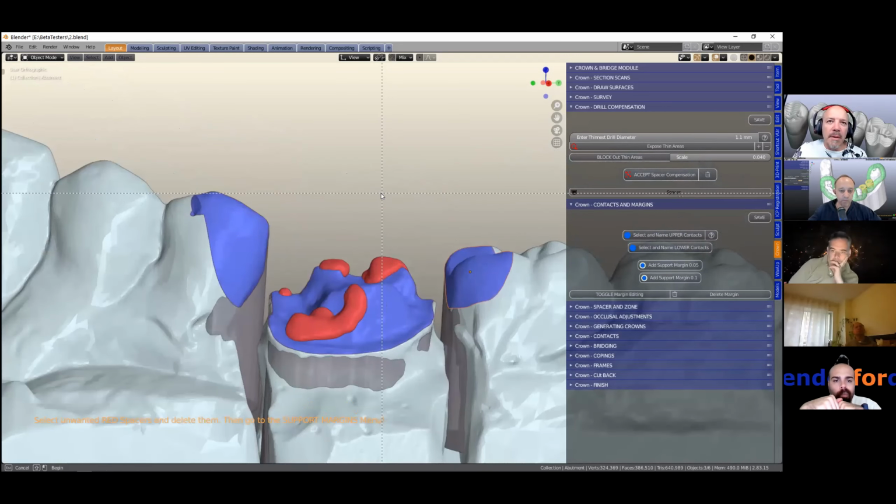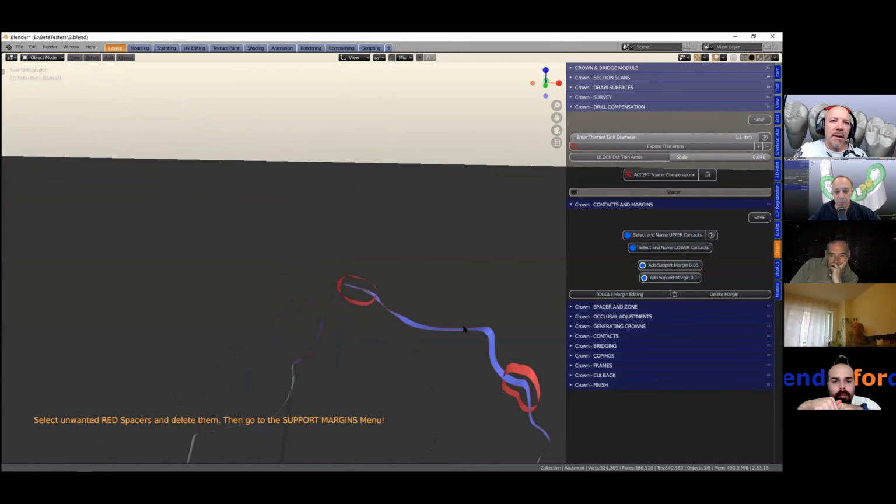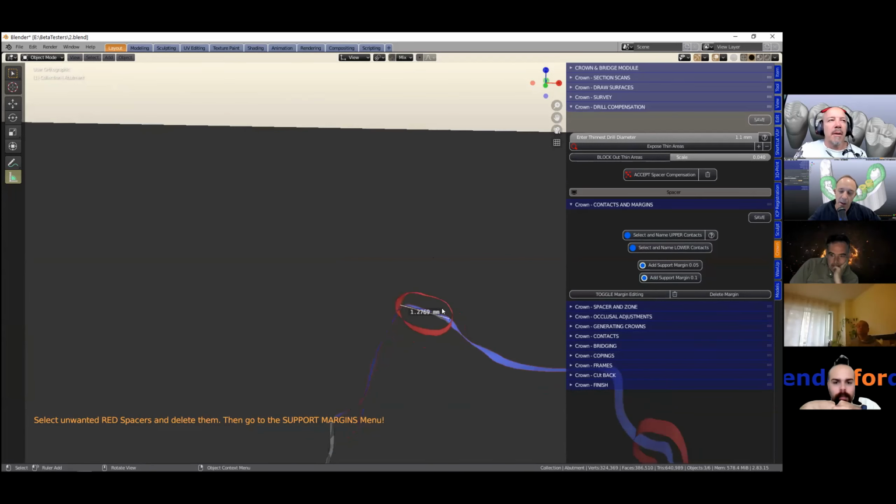Yeah, look, so if I take a cross section of this over here, and then I look at it here, from here to there would give you a measurement. I think it should be close to 1.1. Yeah, it's even a little bit more. Maybe not. It depends on where I've put this thing. So you can see.